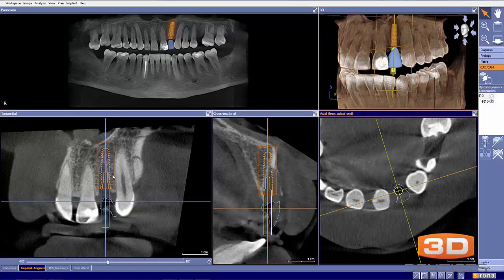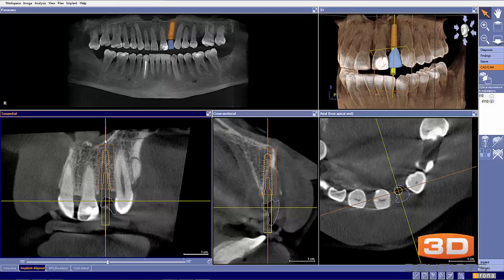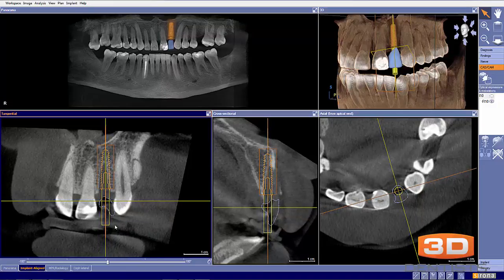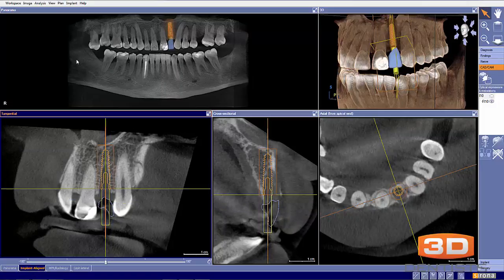Now, obviously, when we do that, we bring this tooth over to the mesial, and then we may just have to move it over, or we may determine that, unfortunately, we have to compromise a little bit and get it along this line right here. Not quite as what we had before, but still better there.